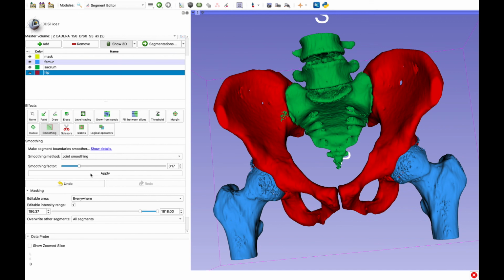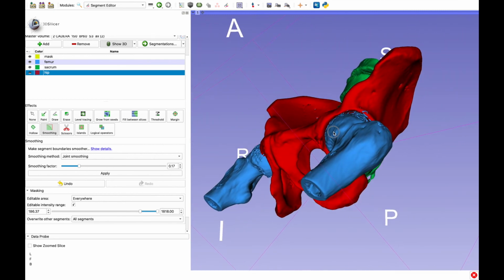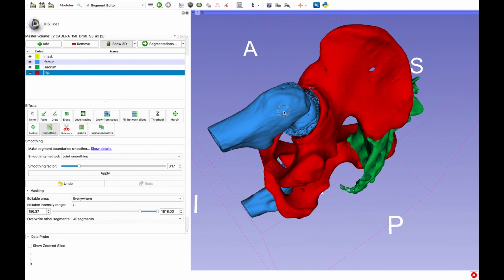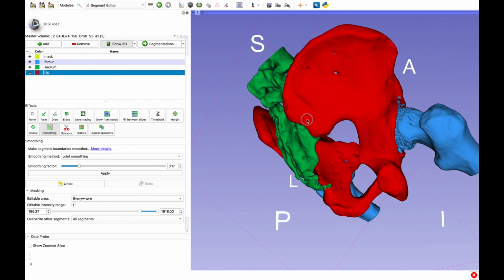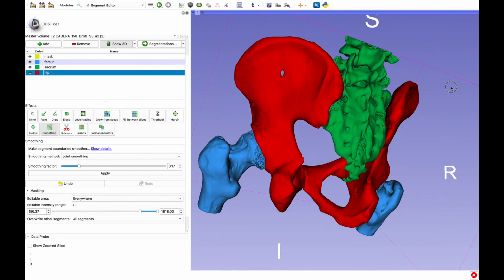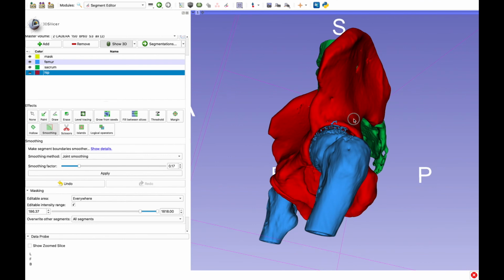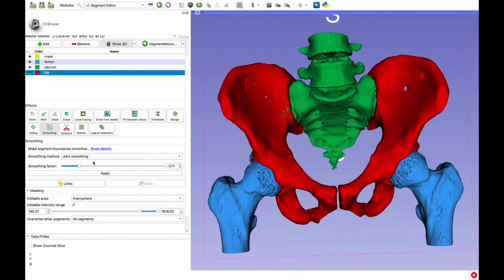We're going to click apply, and this one does take some time, so I'm probably going to do some time traveling again and speed this part up. All right, so it's been applied. The joints are a little bit cleaner now, and there's one more filter we've got to do. If you've noticed, there's a few holes in our model. We got to fix those too. But otherwise, it looks pretty good. I'm sure yours looks great too.